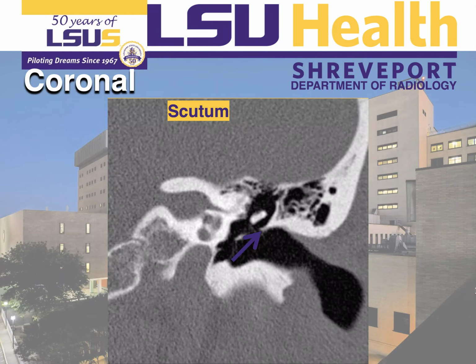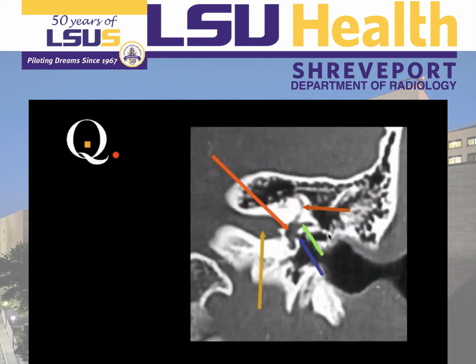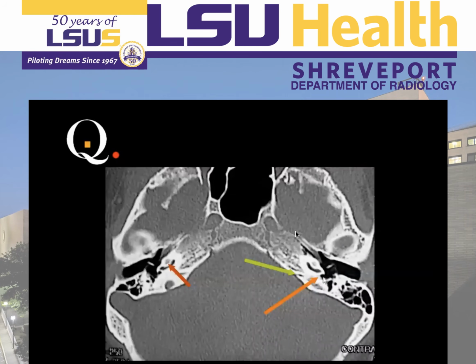I'm going to give you the answers, guys. So this is the anterior or superior semicircular canal, this is the lateral semicircular canal, and this is the posterior semicircular canal. Here is the internal auditory canal, and this is the vestibule. Here we have the cochlea.